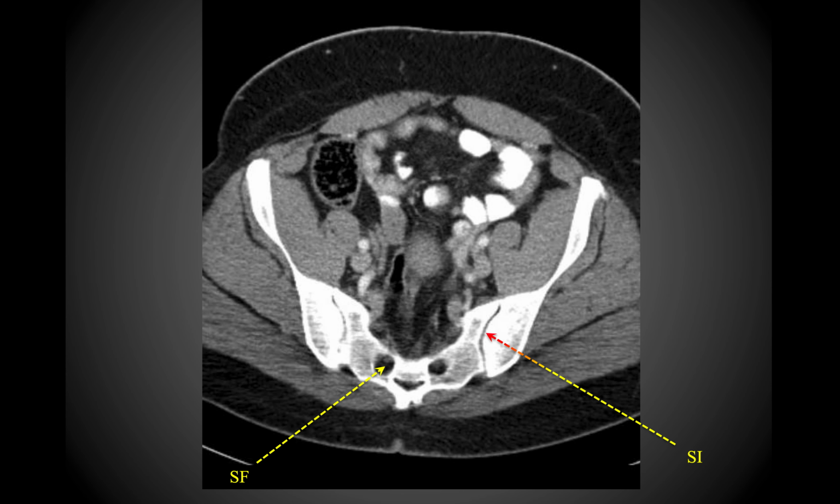Now looking at some of the bony structures in this image, so this is quite high up in the pelvis. So we're actually looking at this point in the false pelvis. So we're up here, located in and around the iliac bones. And so up here you can also note the size of the abdominal fat layer in this individual.